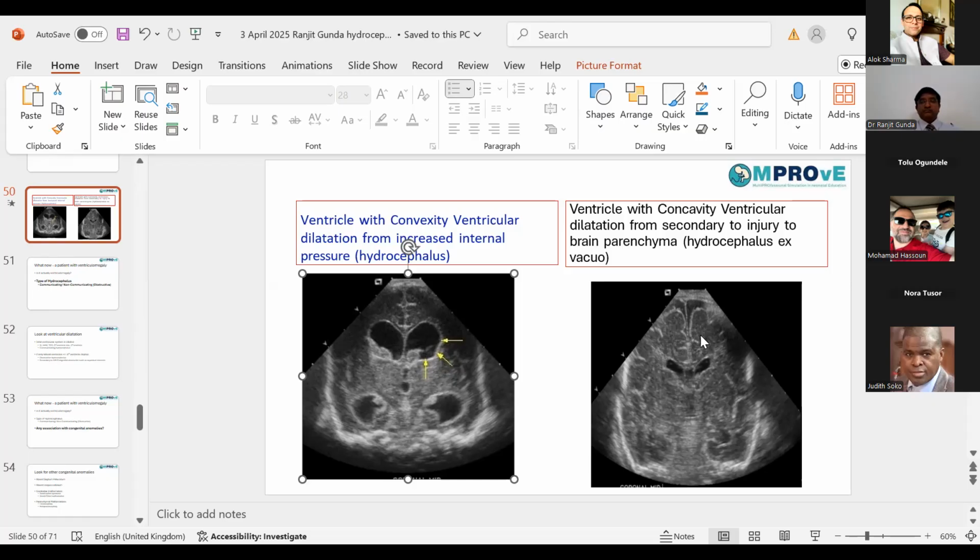often what you'll find is that with hydrocephalus, an enlargement of the ventricles, you'll get clinical signs to suggest hydrocephalus: a tense fontanelle, sutures that are splayed, and you might lose the superior sagittal sinus pulsations. In addition, when you measure head circumferences, they'll be going up. But in hydrocephalus ex vacuo, often you have an element of cerebral atrophy, which is why the ventricles are prominent. So not only are the extra-axial spaces quite prominent, but the head circumference will not be going up significantly. It might be constant.